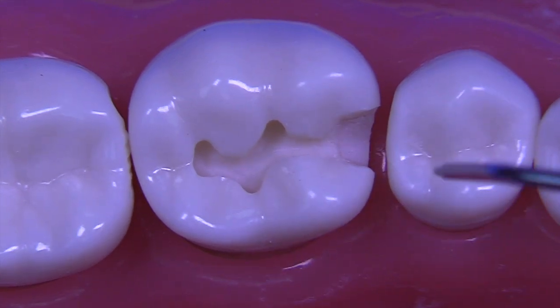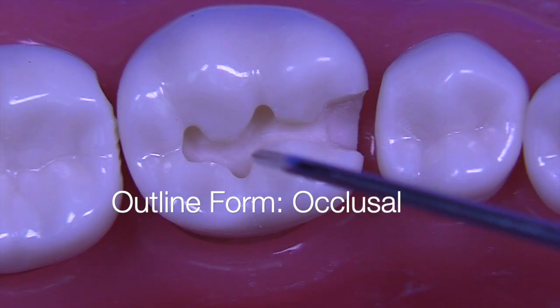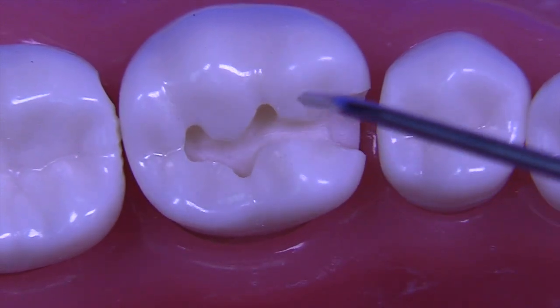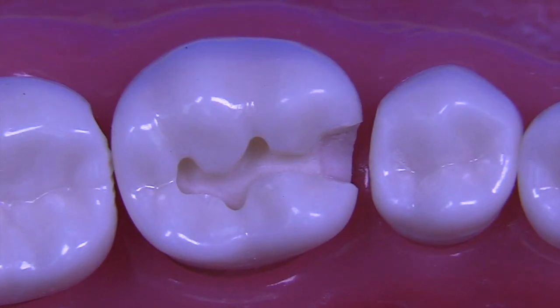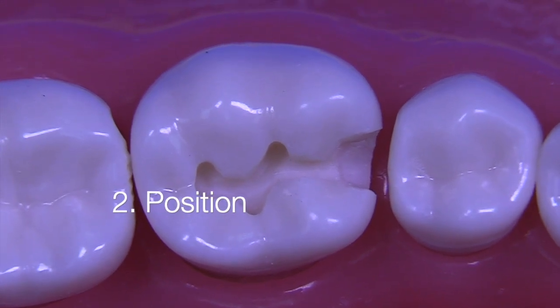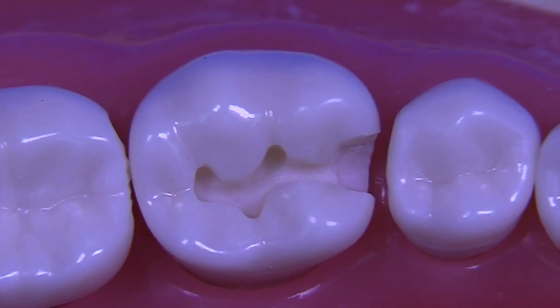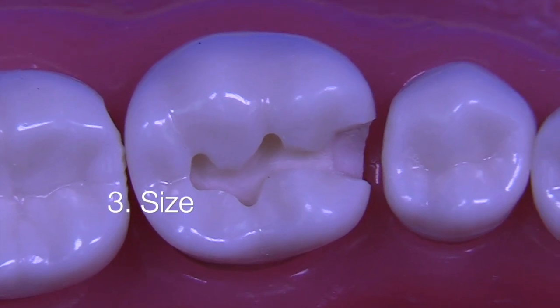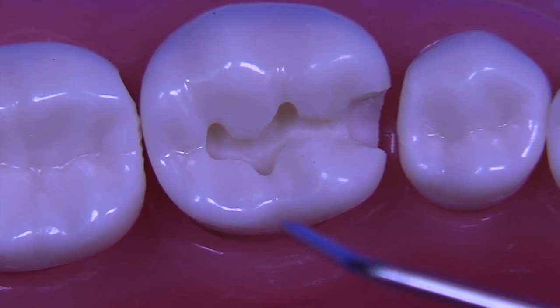And when we look at the amalgam, the first thing we do is we look at the outline form, the outline form of the occlusal, and then the outline form of the proximal. The outline form of the occlusal is going to be broken into 3 parts. How well it flows, in other words, the shape of the outline form, where it is positioned on the tooth, in other words, does it follow the grooves easily or evenly, and then finally, is it of the proper size? And so let's start with the shape or extensions, which also has something to do with the size as well.